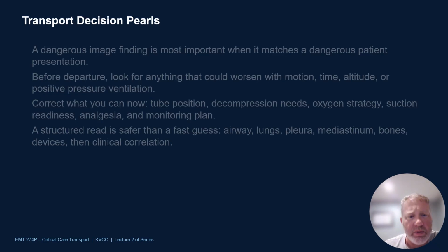One of the biggest takeaways is if you find something on the chest X-ray that looks off, if you can match it to the patient presentation on assessment, then you know that the odds are that that is the case, and you can take action as a result.